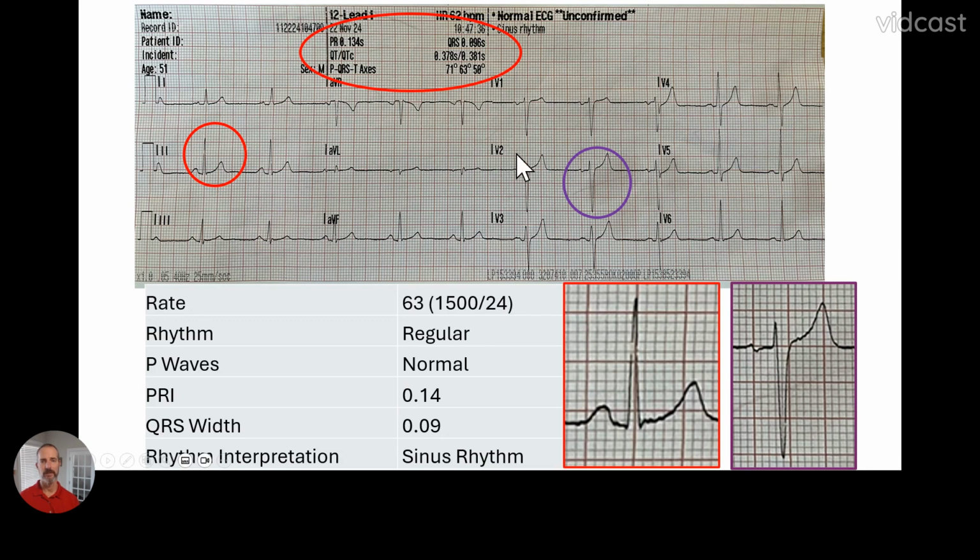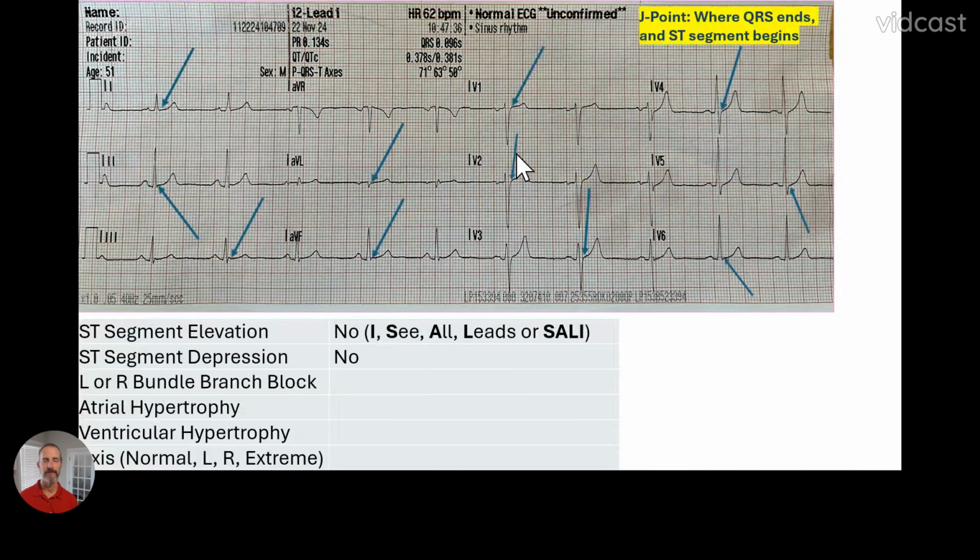So we are well within range there. All right, so good news for me, right? Moving on to the interpretation that is specific to a 12 lead.